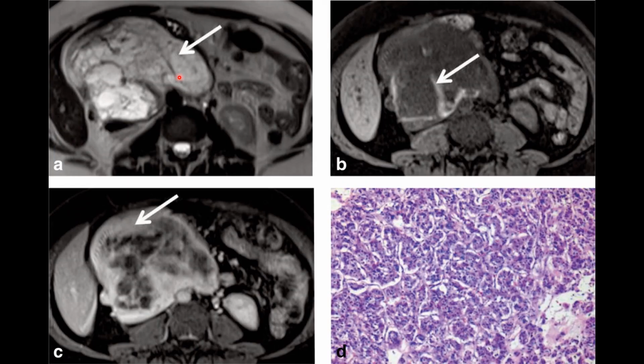Now in this image what we are seeing is, on T2 weighted images, a very bright lesion, looks almost like an entirely cystic lesion, but on T1 weighted it is appearing hypo. This appearance is more like a cystic lesion. Any cystic looking tumors with enhancement can be a neurogenic tumor, or a myxoid sarcoma, myxosarcomas. So these are the tumors which appear like this, but in the context of abdomen, paravertebral appearance, with cystic looking lesions which are showing enhancement with few central non-enhancing cystic areas, and T1 hyperintense areas which can be blood or protein.